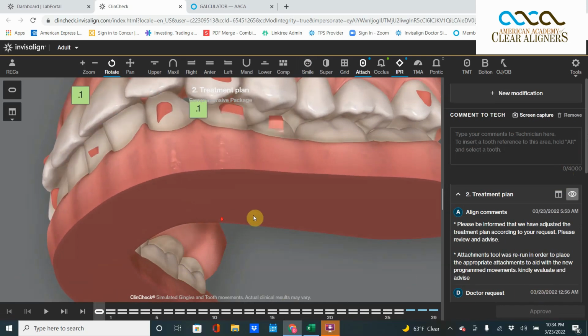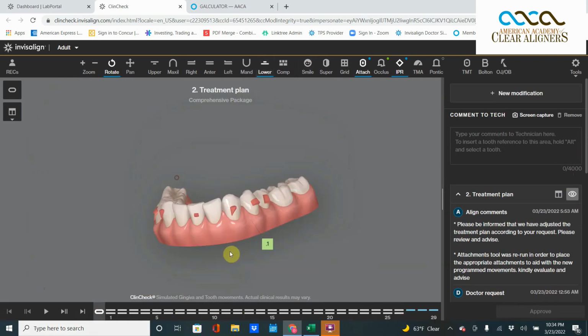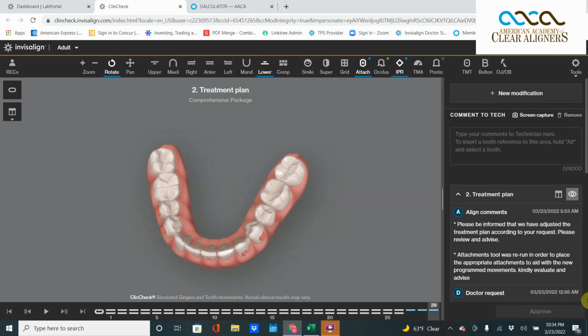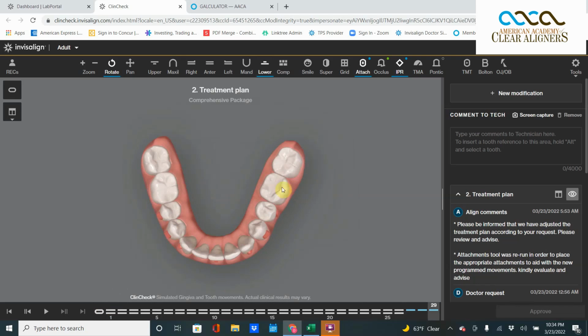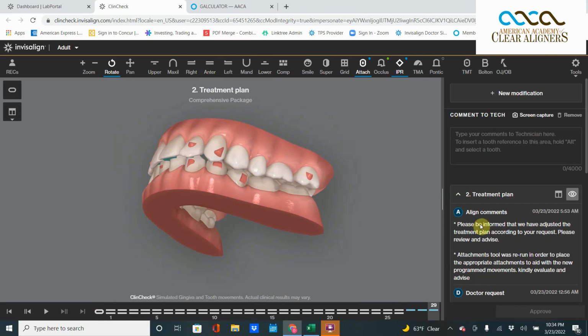So for today's lesson, you have to always look at the end stage occlusion. The end stage occlusion of the upper and lower premolars has to be closed at the end of treatment. And sometimes the system just obsesses with getting the teeth right in the arch and setting them up in a nice perfect circle, which, if the patient had no upper anterior teeth, would be sufficient. But because they do, we have to make sure that we close the occlusion all the way.